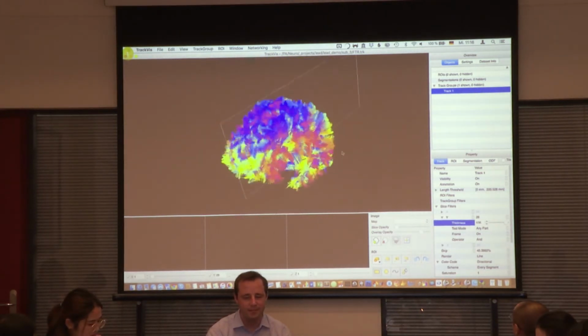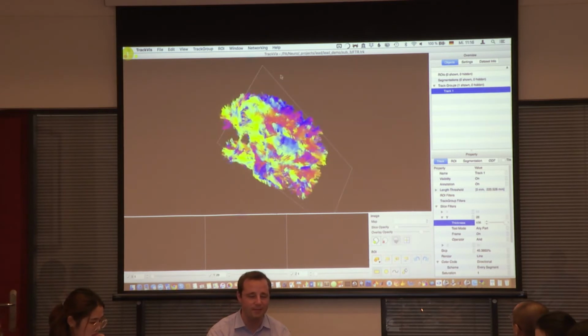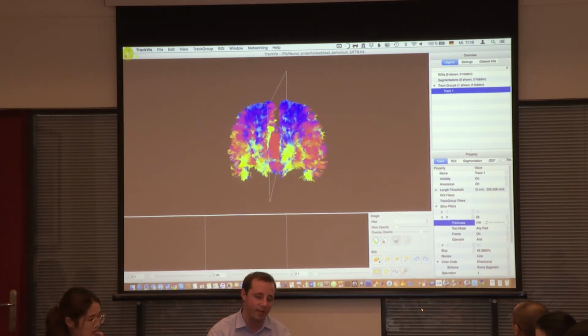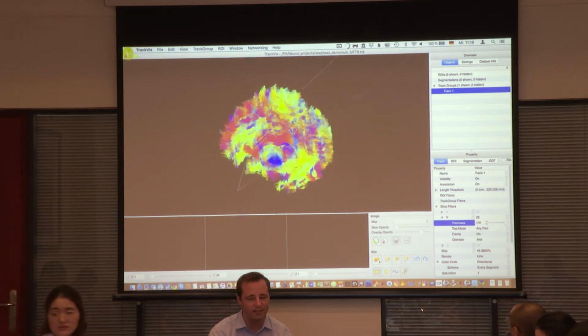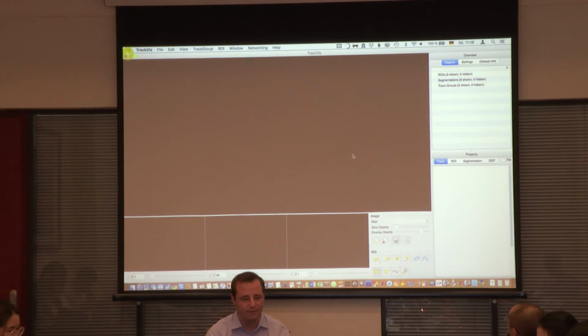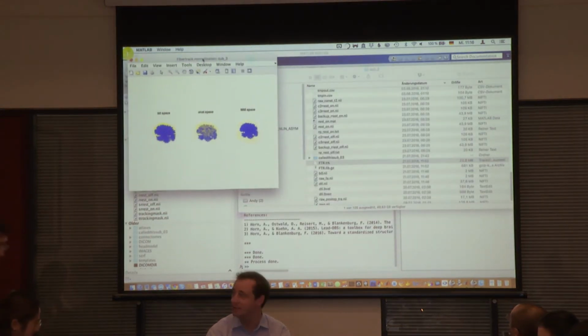You see, for example, there are some issues. Here, for example, there's a gap. That might be because it's poor resolution, or because the tracking mask is not optimal. Except that it looks okay for such a clinical data set to me. Now you see the normalization.